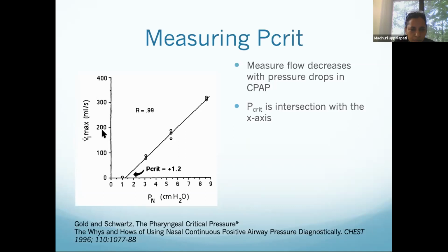All right. Right? At 0, there will be apneas, or whatever, 0 flow. And then at 10 centimeters of water, there will be none. And so you'll look at the flow and you can go all the way down. So that's what you're doing during a CPAP titration. Sure.